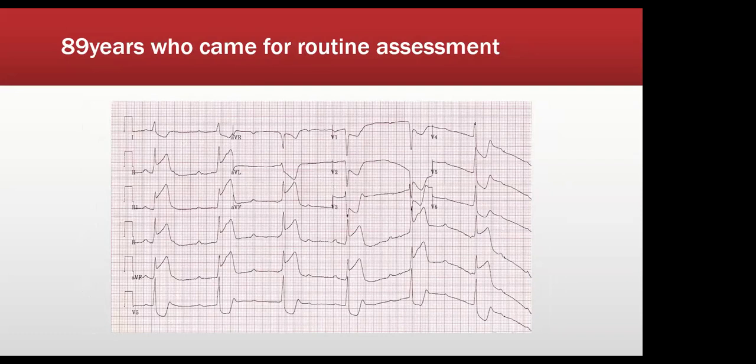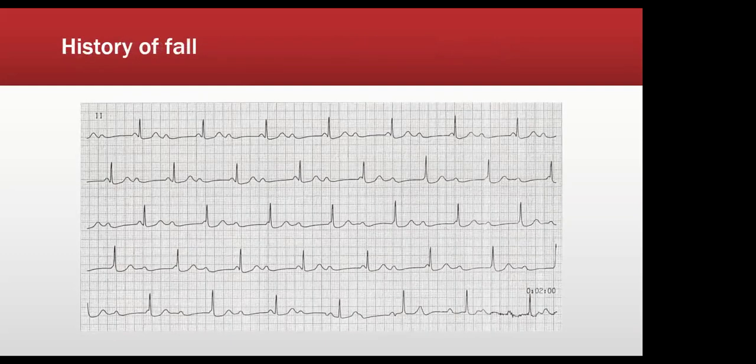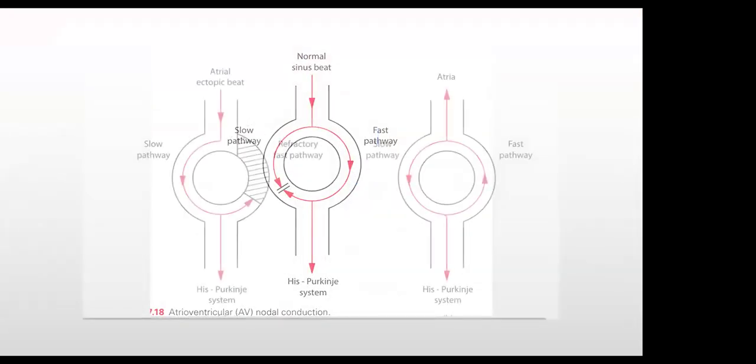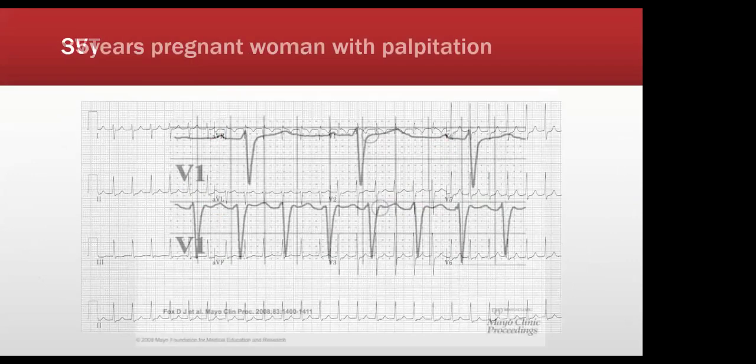What do you think? I think we've looked at all these. Okay, so SVT. So I won't discuss this. I'm sure Vlad may discuss all this in detail. So I'll leave it out. Same here. I'll send the slide.